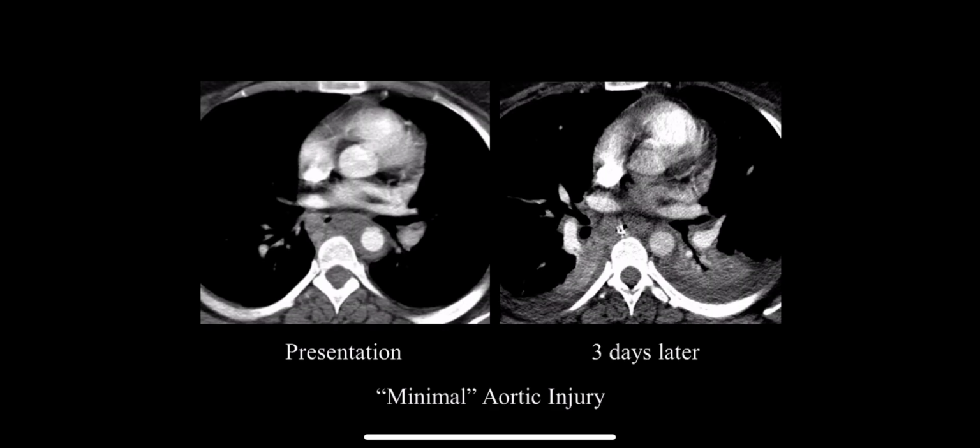This patient sustained a high-speed MVA. We see definite periaortic mediastinal hematoma, and in the mid-descending thoracic aorta, we see this subtle irregularity of the aortic wall. And this would be an example of a so-called minimal aortic injury, where often these are followed conservatively, but important to recognize. And in this patient, we see a CT scan from 3 days following the injury. We see decrease of the mediastinal hematoma and a normal appearing aorta, so resolution of this minimal aortic injury.